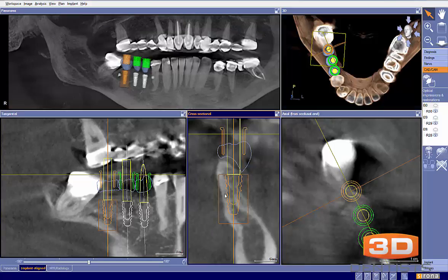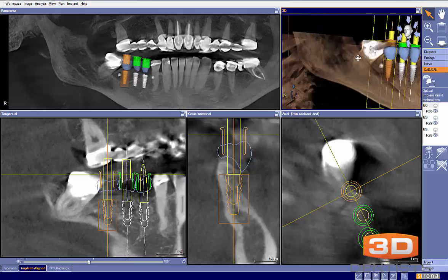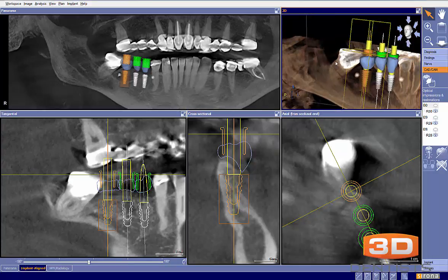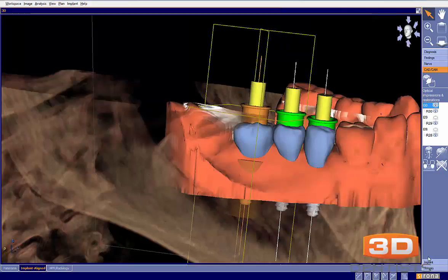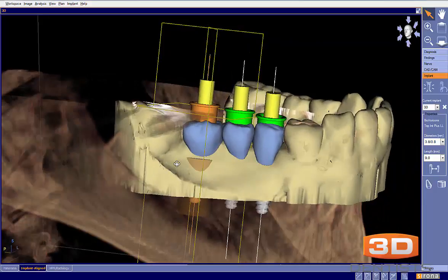So these are the things I would look at in this case. Personally, I would start by considering removing tooth number, let's call it 31 here, and then replanning these teeth virtually, so that way we can get a better idea of where things need to be, and we can take a look at where I think the gingival margin should be in this particular case anyway.